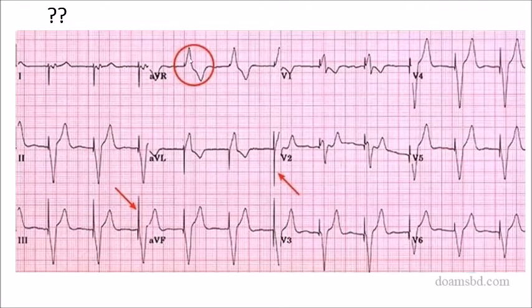So the question is another type of ECG. Who can say? Can you try? What is this? It's very simple to take the history. But if you don't see the patient and you are given this type of ECG, we must be able to identify the normal appearance of ECG also. Is there an abnormality? First thing, yes, it is not the normal ECG looking like, but for the patient, is it dangerous or not? Another question: there are some additional markings, you see.